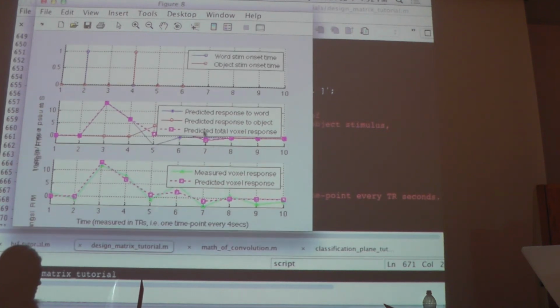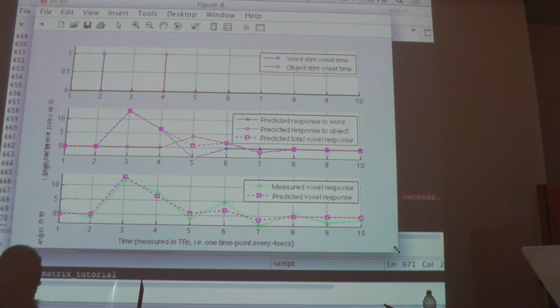And what my regression does is it says: if you give me some units of the thing that this kicks off, and some multiplication of the thing that this kicks off, find me the best amounts to multiply those kicked-off things by and then add them together to give me the best approximation you can get to this thing I actually measured.